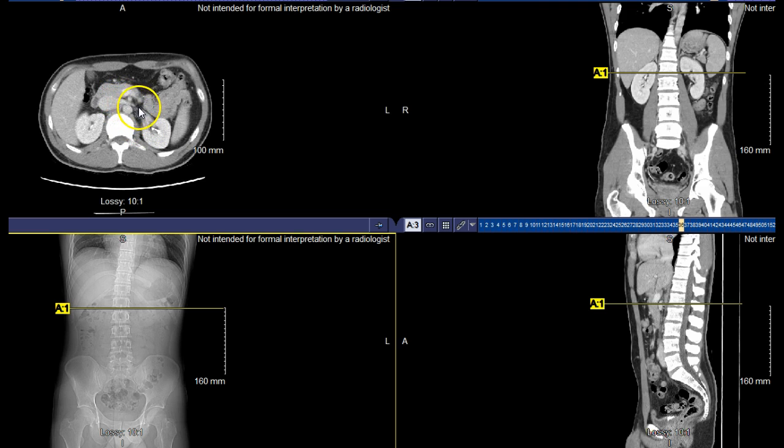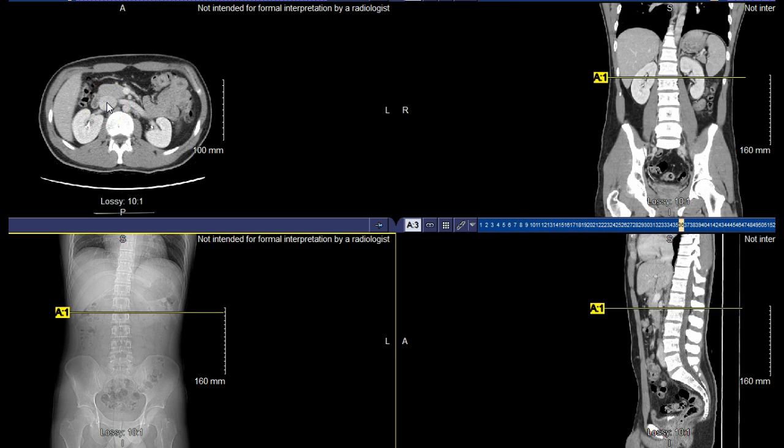So the renal vein is right in here. You can see respectively this would be carrying over to the left renal vein, and you can see that connection really well on that particular slice. So that's why it's important to go through slice by slice and see where these articulations are.